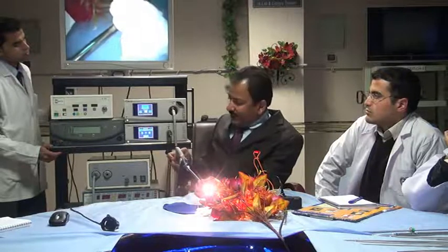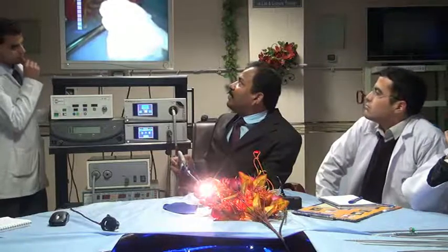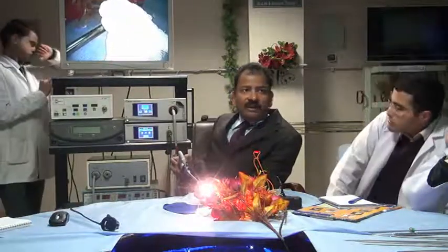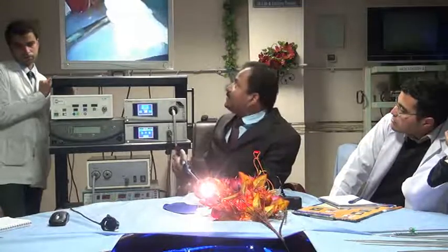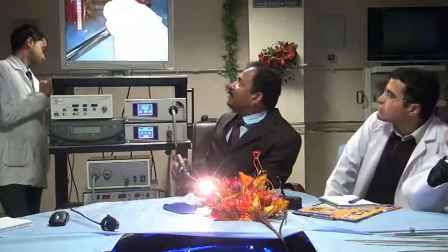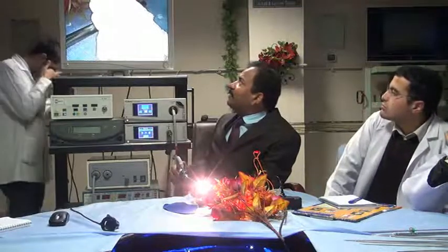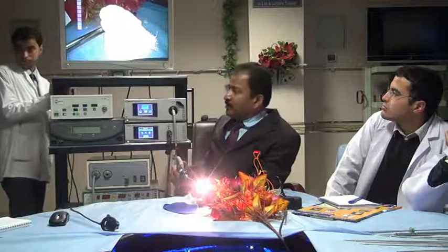And if I would like, with the digital enhancement I can make my image more crispy and it will have more pixels. Focusing will be done by this button. Now this is zoom in, zoom out. See, it is coming nearer. Without going nearer, I brought this nearer. And then I will throw it away. No need for camera.